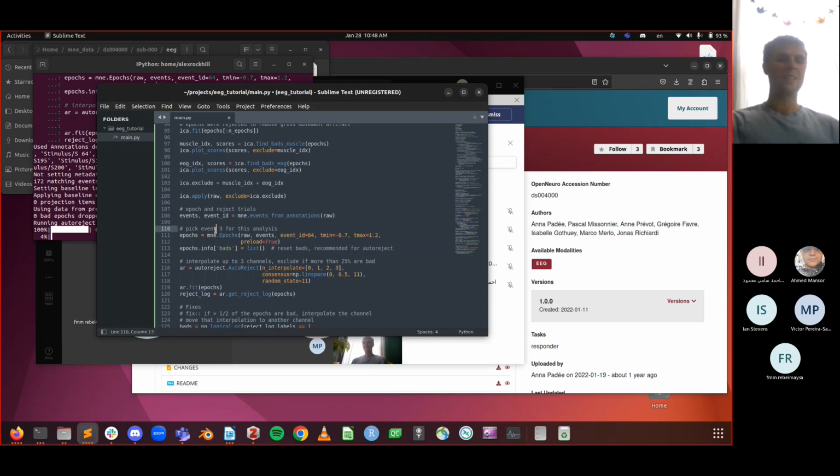I mean, if you've made the data set and you're not getting it off the internet, then you should know which events you've triggered. But if we just pick an event to study, we could try and classify it compared to another event, and use deep learning, classical machine learning, or classical statistics to figure out which features of the time course or which features of the time frequency decomposition are important for classifying, or just build a really good model if the application is much more that the algorithm just needs to work, like a brain computer interface or something.